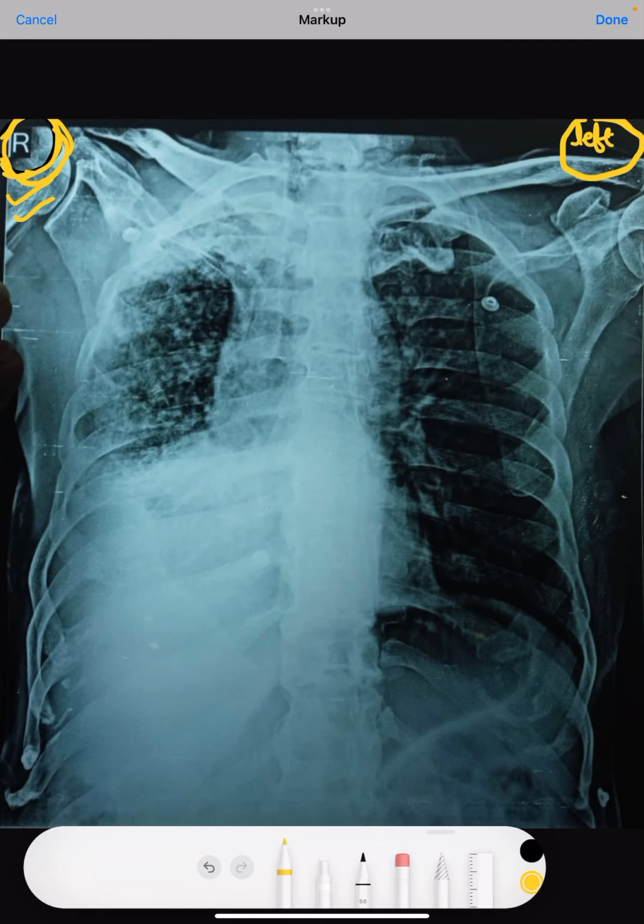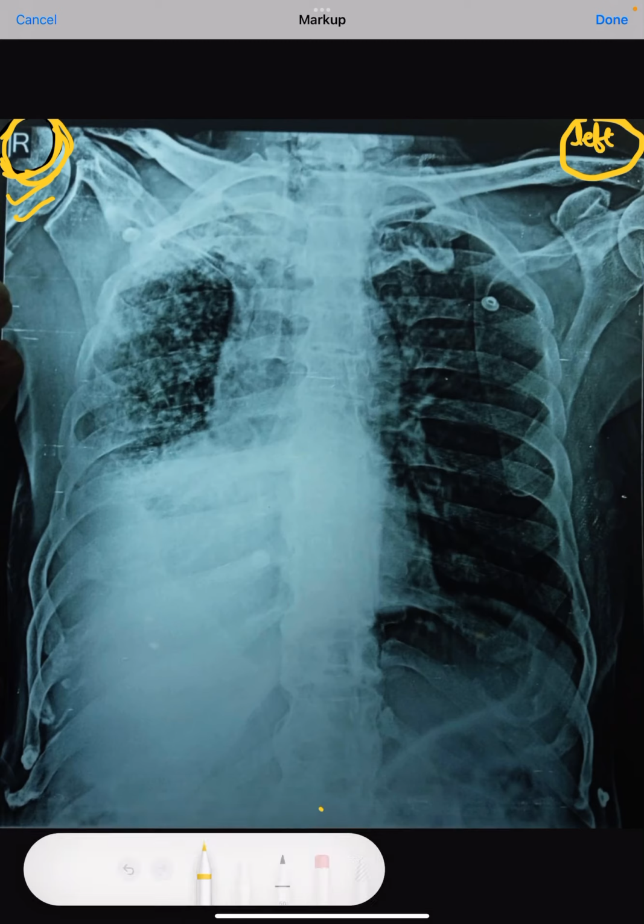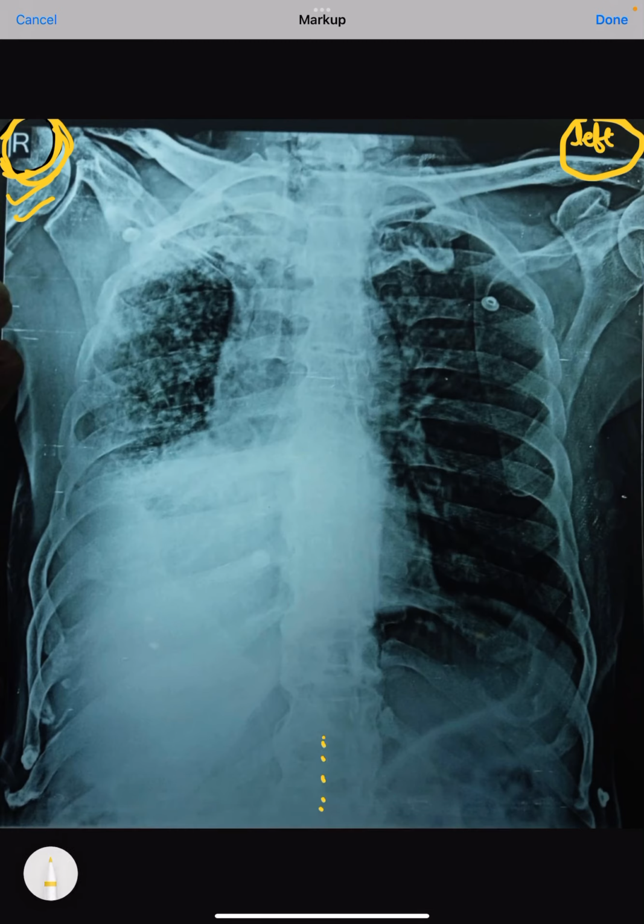So what we can say is, if we draw the midline, see, we can draw the midline here. So the midline is more in this area. So in short, the heart and the mediastinum are completely shifted towards this side. There is no structure, and there is no effusion or mass on this side. This is more of an empty, or more of a normal, side.